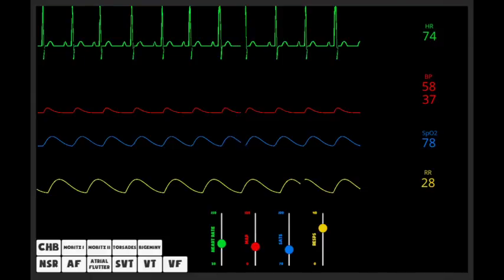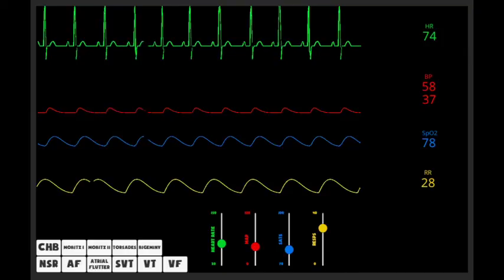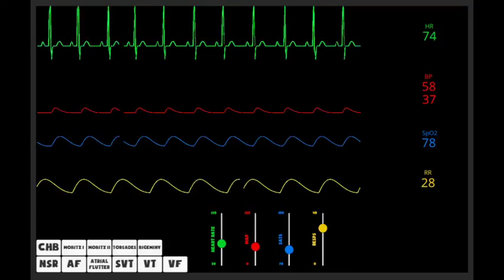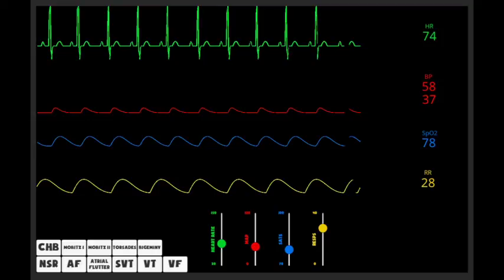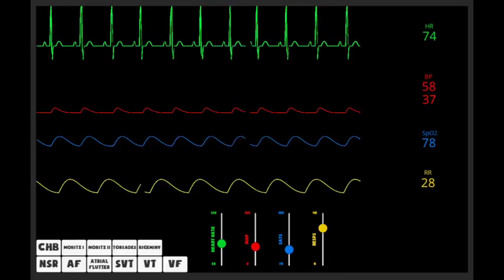So having seen the life support simulator in action, this is a companion app, which is a wireless remote control that can be used by instructors and life support teachers. Just like the simulator, it's cross-platform, so you can run it on your laptop, on your handheld device, or in fact on your smartphone because it's not too processor intensive. It will automatically detect any copies of the life support simulator that are running on the same wireless network.